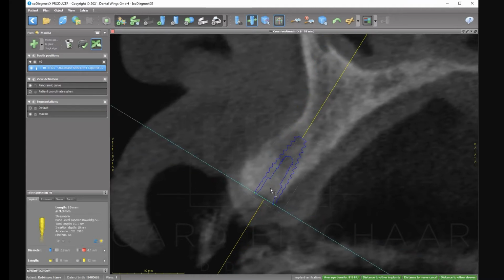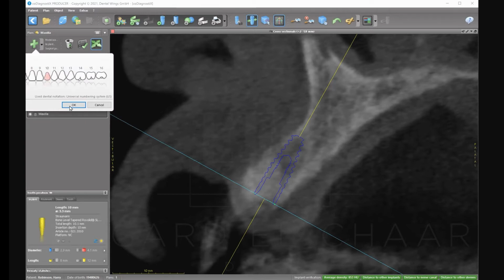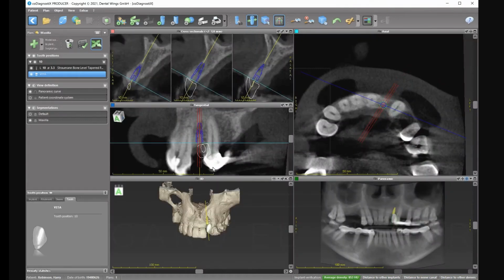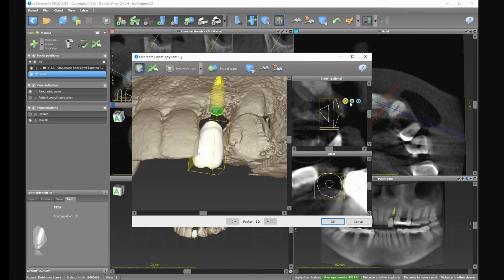Now if I position it like this, it's a problem. I'm preparing this for my student, so I'm telling you everything, but I make a tooth. You make a tooth, number 10, he brings it here. Now you want to see how it occludes with the bottom, and we will get to that. All right, so see, this is where it is. I bring it down here, I turn it around, I fix it. Now you can see it is not really correct. I can do it like this. Yep, all right, and now I can take it even further, and I move it.